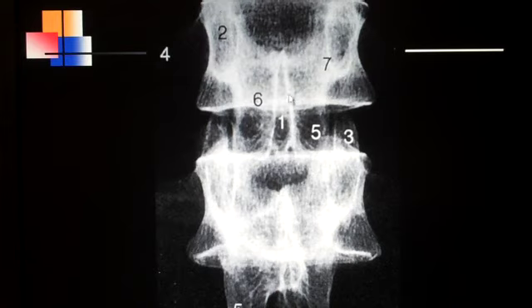Number one right here is a spinous process, goes all the way up to here, goes all the way down to here. Looks like it's almost hollow, but that's because you see the periosteum stands out more than the inside of bone, and spinuses in the lumbar spine are actually very flat and very thin, and so that's why it sort of looks like it's hollow, but it really is not. That, of course, is the periosteum right there.